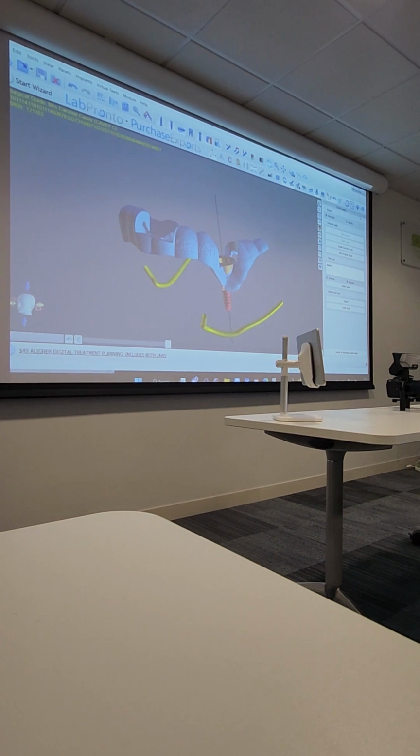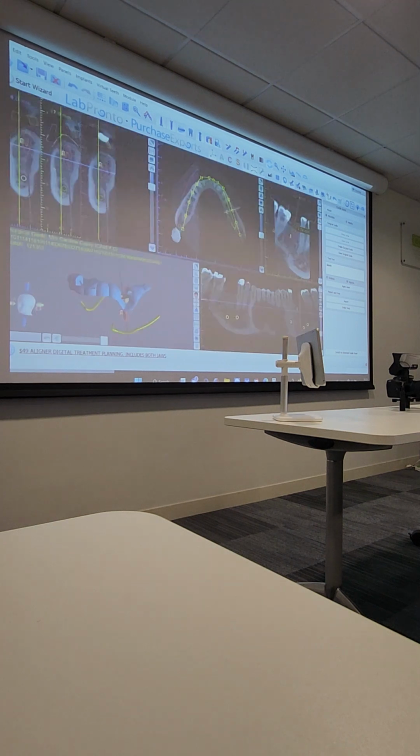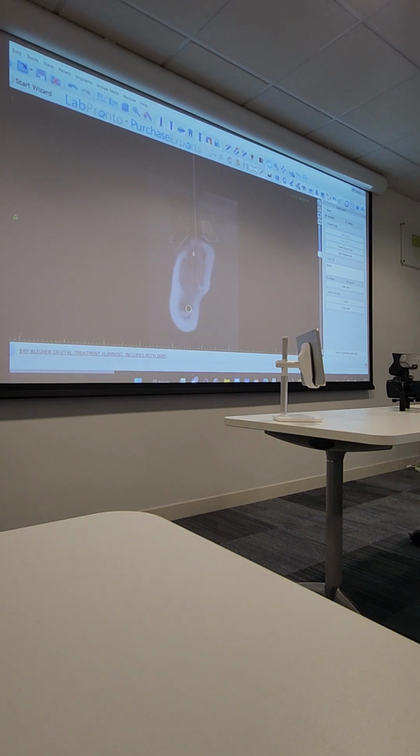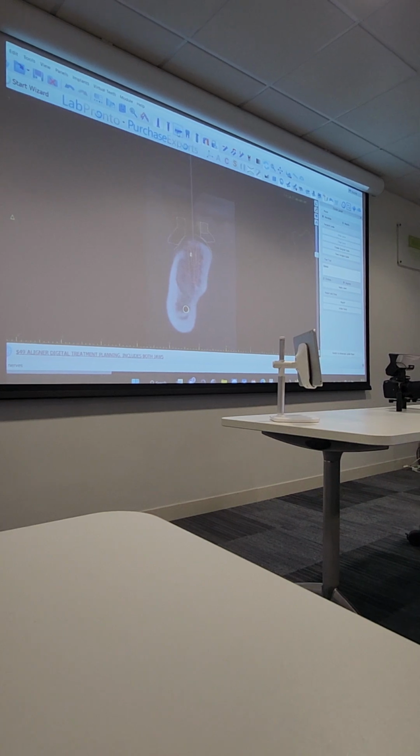Make a start. Can I just ask, just going back to the ID method, did you just plot it automatically? No, it did it automatically as we downloaded the CT scan. And it's always accurate every time? Always accurate. Yeah. Always. But, again, you can't miss it. You can't miss it here. Look, if I take that nerve out, here, play around with these. You can hide everything as you wish. Look, you can see the nerve there.